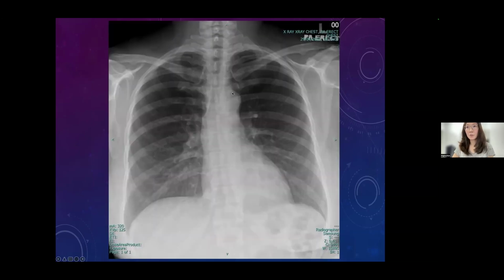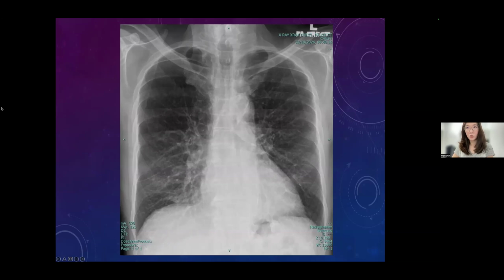Okay, look at this patient. You see above the aortic knuckle, that's actually fairly clear. So that's why we must really, really look hard to see if there's any abnormal opacity on a chest X-ray. Compared to the normal from just now, when you see here, you will notice there's actually opacity above the aortic knuckle. All right? Because when you focus on the fibrosis and you think you got the diagnosis, you will miss that.